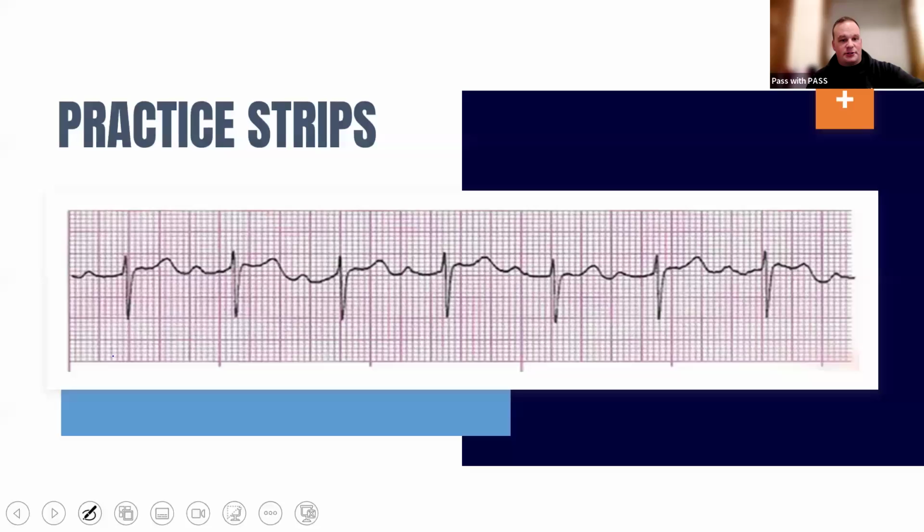All right, those are the rules for heart blocks. So let's look at a few practice strips, and that'll be all I have for tonight. So what do we have here? And feel free to put it in the chat. I'll give you a second to look at it. So this is a first degree heart block.